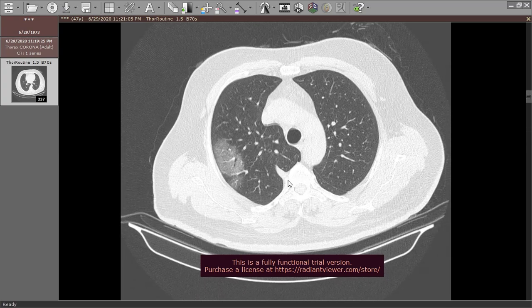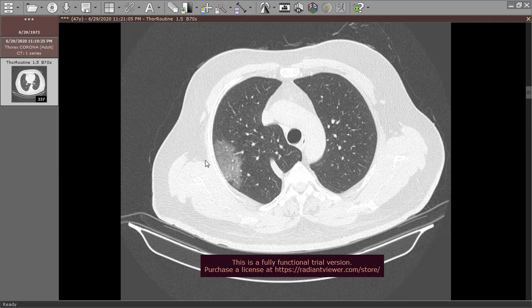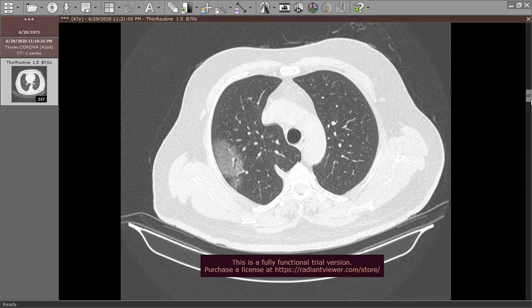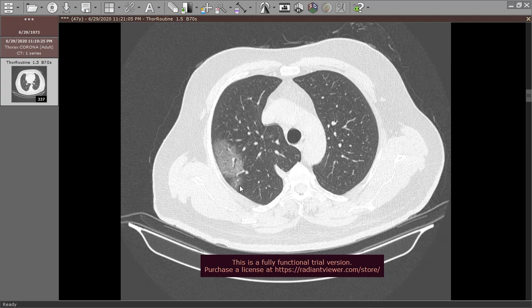The main pathology here is what's called ground glass opacity or ground glass patch. We mean by the ground glass patch or opacity a white part of the lung which is characterized by being so clear that you can see through it the traversing vessels; it's not obscuring the traversing vessels as in cases of consolidations. Also with smooth air bronchogram inside it. It is smooth and homogeneous without any septal thickening, without any areas of air trapping, and of course it's mainly peripheral and subpleural located.